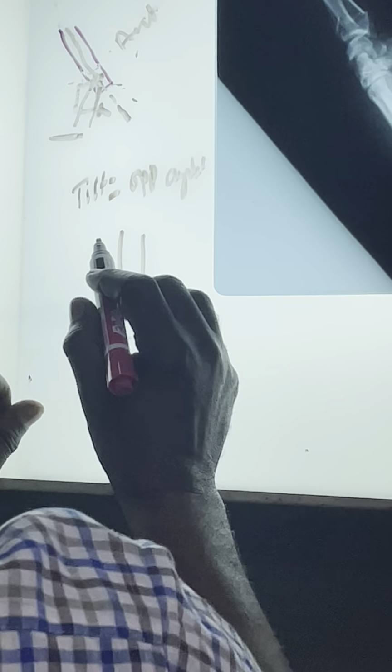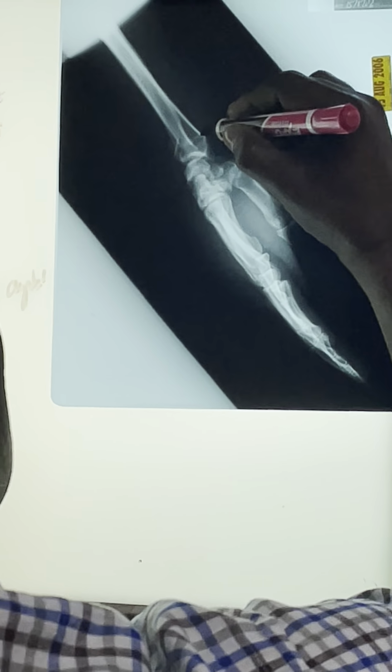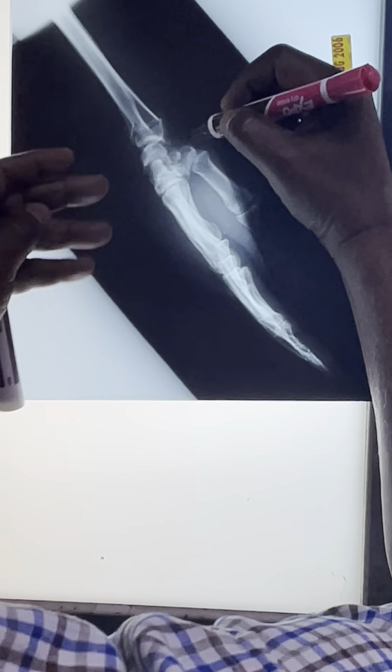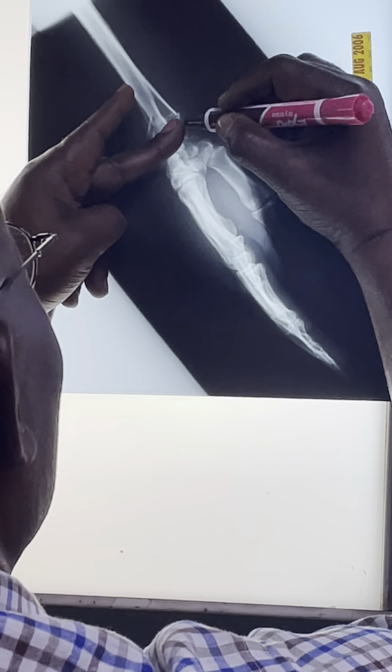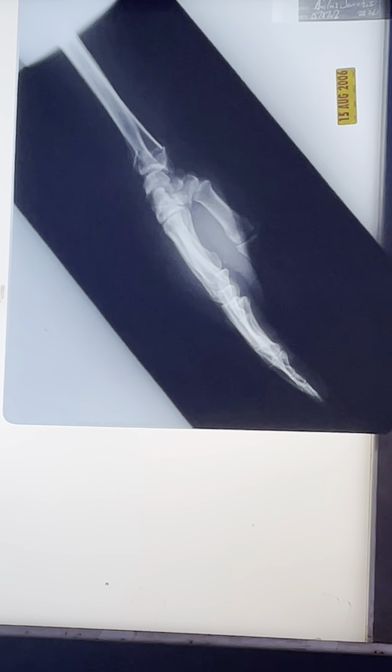But remember, it doesn't go in one plane, but they also have this angular thing we talk about as well. And you can see that, right? Because if you draw here, you see where the fracture should be here, right? So you see right away it's gone. You see how it's formed an angle? Yeah. It's gone over here, so it's formed an angle. So that's the tilt. Because I need to correct that, I need to bring that forward. You see that? Likewise, if there's a shift, I need to bring that back over here as well.